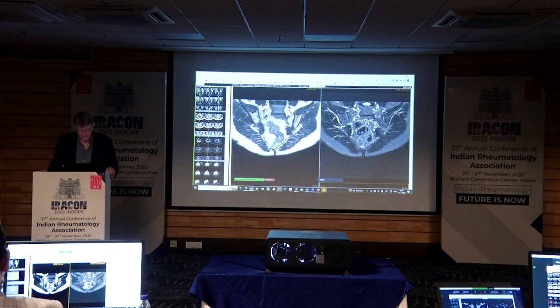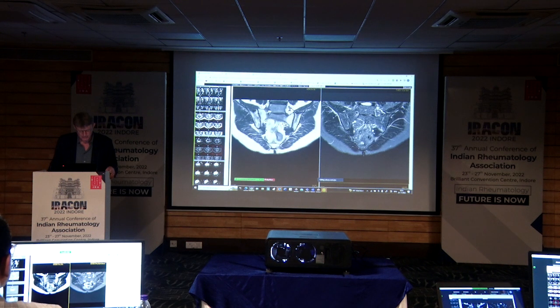then the first areas are always difficult. It seems to be a lot of fat infiltration already from the start, and that's present both in the sacral side and less, but present also on the iliac side. And it's very easy when you compare with the sacrum, the color. Then the joint overall definitely doesn't look normal. It's not normal.